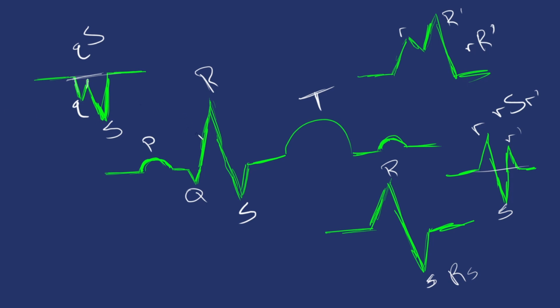Whenever you're doing measurements or anything, you're going to use whatever the largest one is as the R wave. So if we're measuring an R to R, you're going to use the R in this case. In this case, you would use the S, so it would technically be an S to S. This is where things have not really made sense with how they're equated.